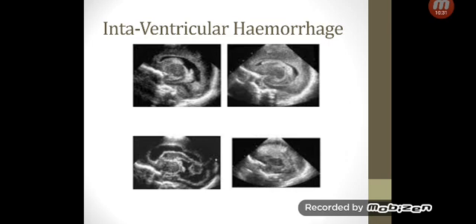So going back to summarize, because I know you can get really confused with the slides going forward without comparing them. This is a grade 1 IVH, subependymal layer, localized, not going anywhere else. Grade 2 covering less than 50%, so this is the choroid plexus, so the hemorrhage is here, and there's no dilatation in the ventricle. Then grade 3 with a dilatation of the ventricle, and then extending into the intracerebral matter, where it becomes a grade 4.